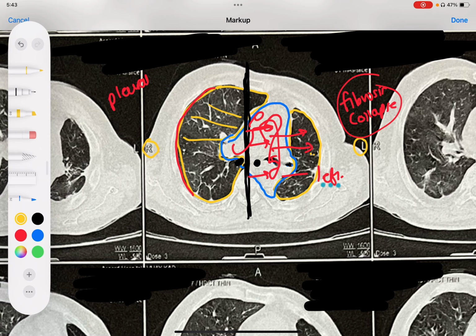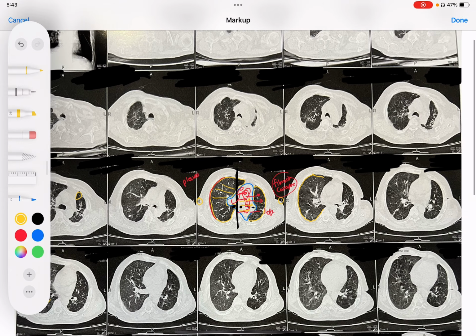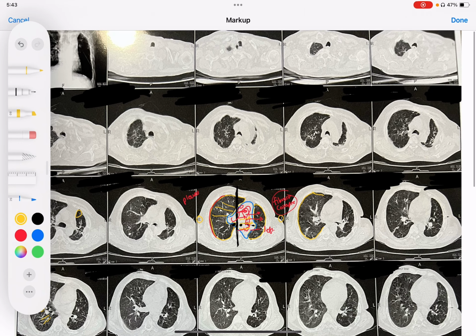We can trace the lung up to the periphery, up to the rib margin. So effusion is not there, mass is not there. So the mediastinum shifting, heart shifting, and tracheal shifting is all because of significant lung parenchyma loss on the left side. We can see it here also. We can see the right lung. There is no left lung because this is all fibrosed.